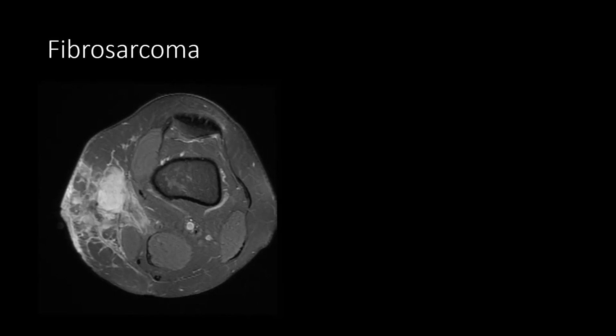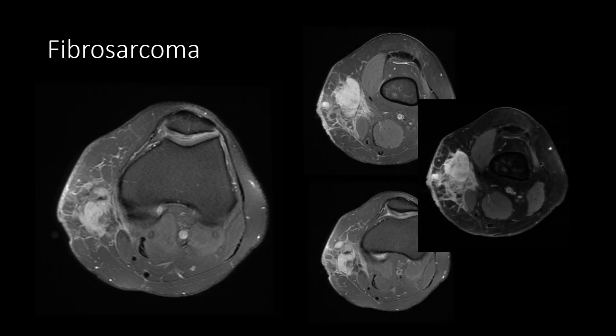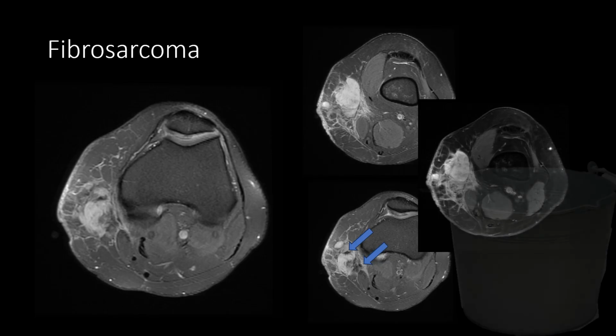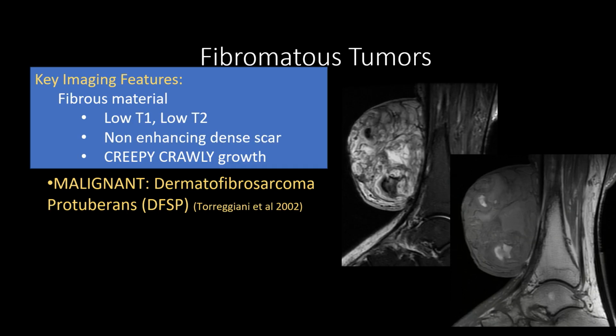Ugh. This one's just big and gross. This was a fibrosarcoma also, but it's very lobulate. It's behaving very much like a dedifferentiated sarcoma. This is oftentimes where these fibrosarcomas are going to go. We may not see these areas of fibrous makeup in here, but this is going to be a hard one. It may just go into the sarcoma NOS bucket as well.